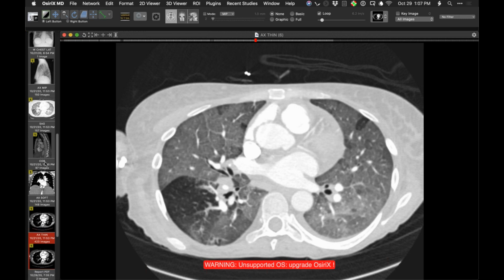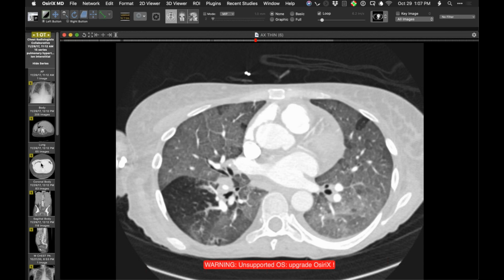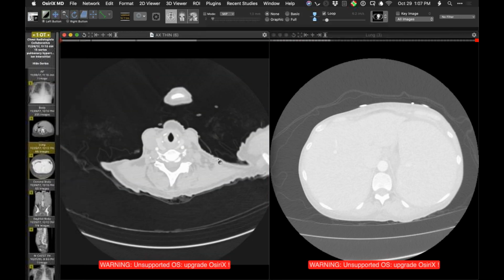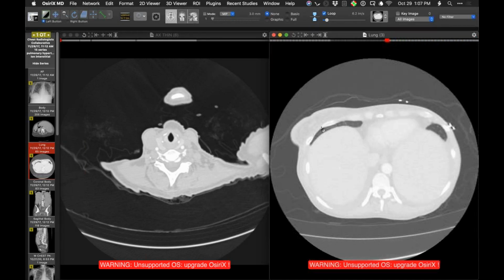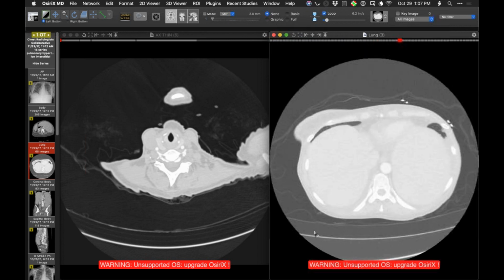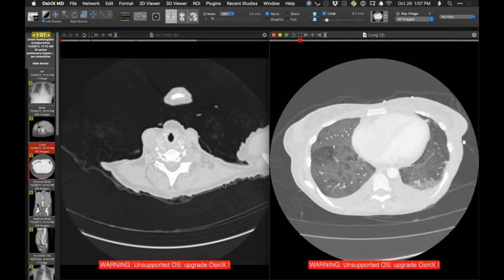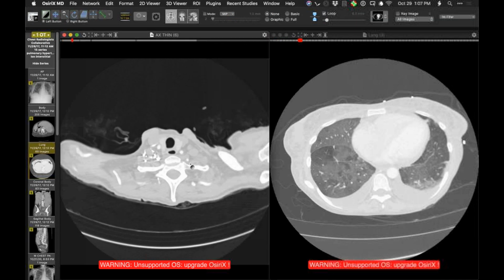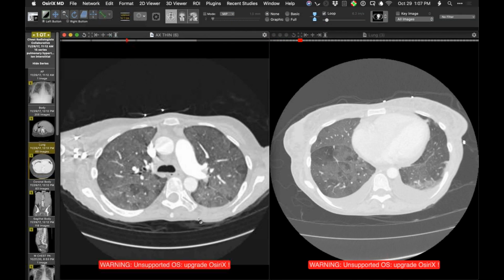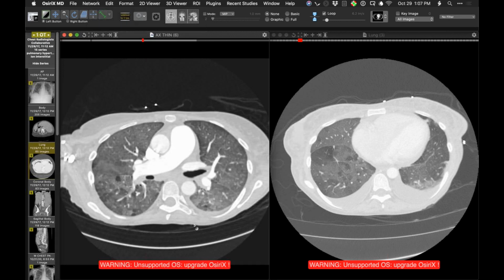So what wasn't done was to try to find another, at least another image showing the lungs. So I'll show you, for comparison, that this process is not new. This is 2017. Pretty close to the same in the lower lung zones, as you can see there. And you will see splenomegaly. So, of course, now we know that it's a chronic process, severe but chronic. And there's a question of whether the pleural fluid represents the same process or maybe some lung edema superimposed on it. So, of course, really, the history is really important here.